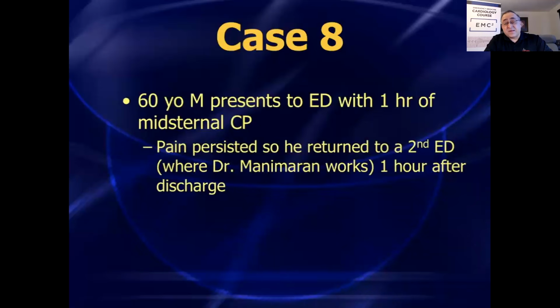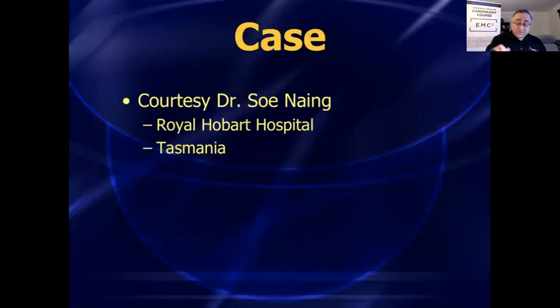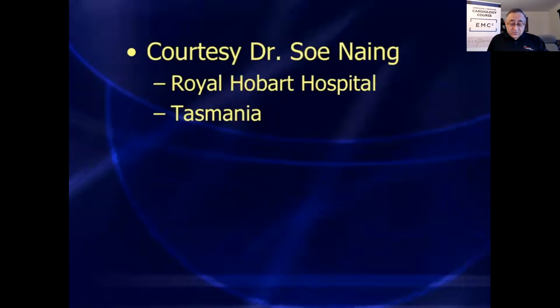The pain persisted, so he ended up returning to another emergency department. That's where Dr. Manimaran works, and he saw the patient about an hour later, and upon arrival, unfortunately, the patient collapsed in cardiac arrest and could not be resuscitated, and that's when Dr. Manimaran was able to access the original EKG and discovered that those hyperacute T waves had not been recognized. So in this last case, I just want to go through the hyperacute T waves once again.